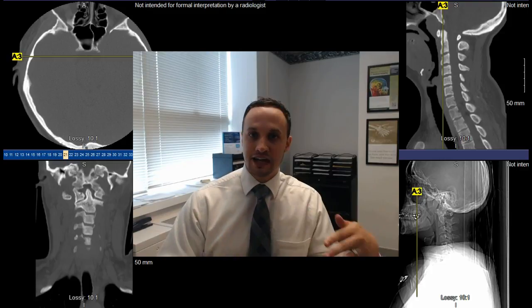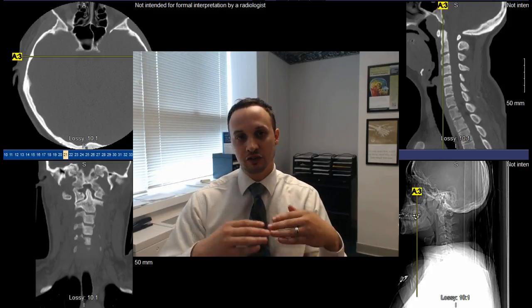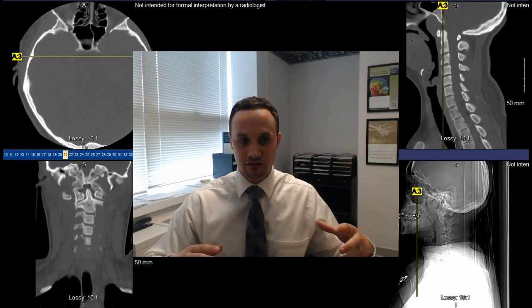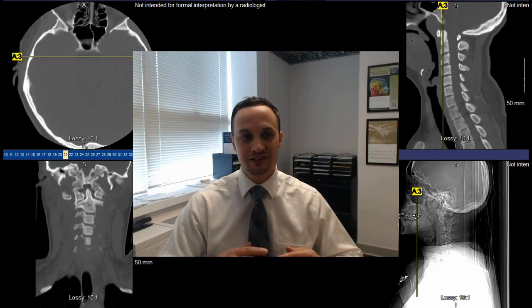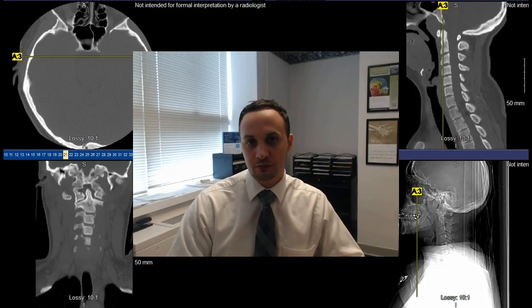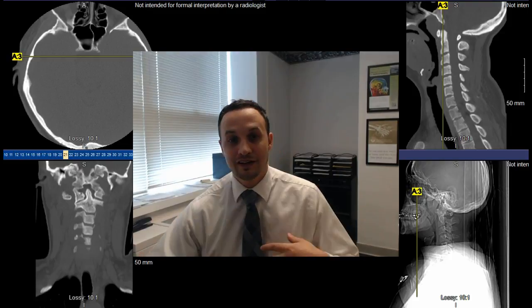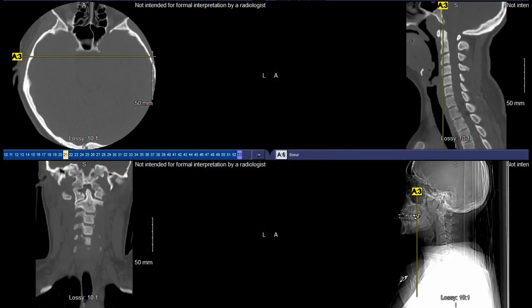So we have that axial image, we have the coronal image, and we have the sagittal image. So you'll kind of see where we're at. And I think, like I said, it'll bring things together as you can see how they kind of work together, and you can see those articulation points as they look in an actual scan. So let's get started. Just kind of looking at the anatomical structures here, we'll focus on the axial orientation first, so the upper left orientation.